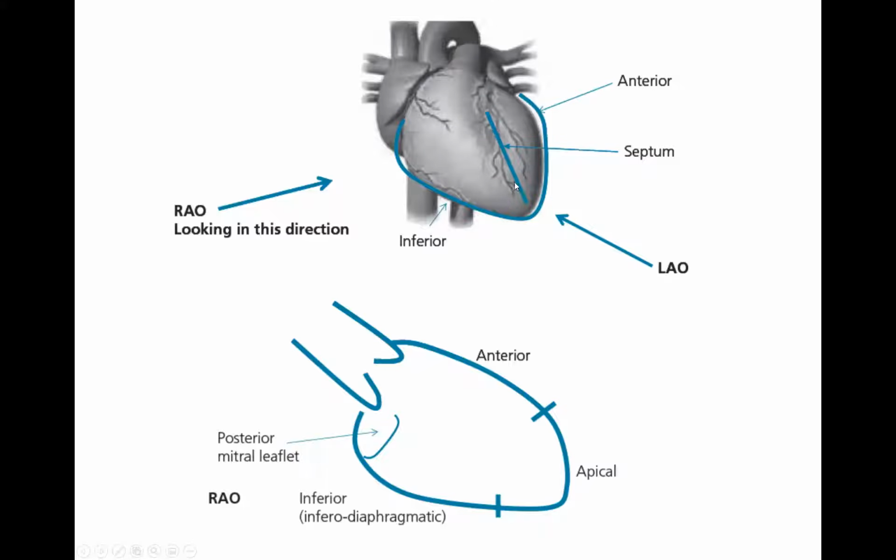You do not see the septum too well. You do not see well what we call the posterolateral area, hidden in the back of the heart, the circumflex area. So you see LAD and PDA specifically well. In my interventional board recertification, they showed me an LV gram with a dyskinetic inferior wall, and they wanted me to identify which artery.